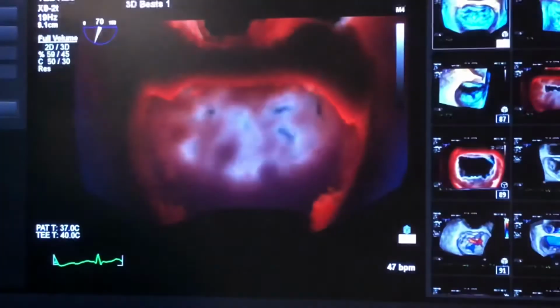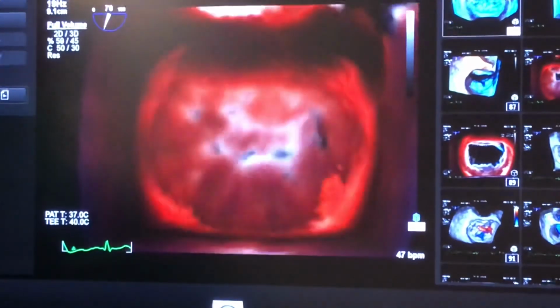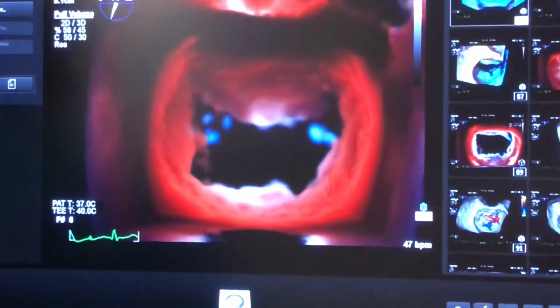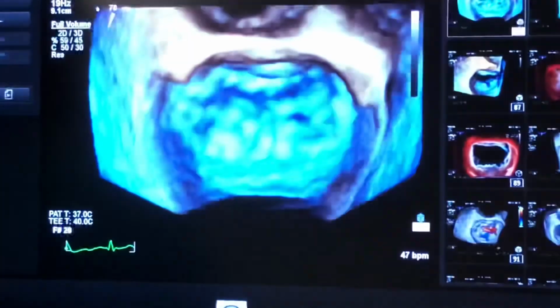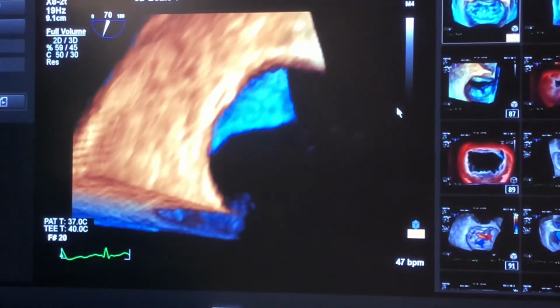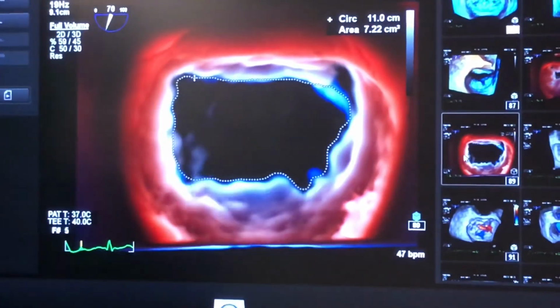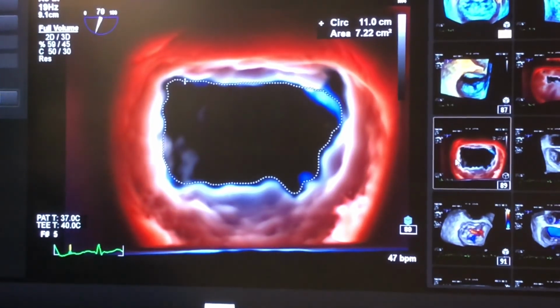And we can manipulate the data however we want. Well, we knocked it out because it's a recorded picture, but basically we could cine that and get to our spot right there. So that's how you would get that border defined.